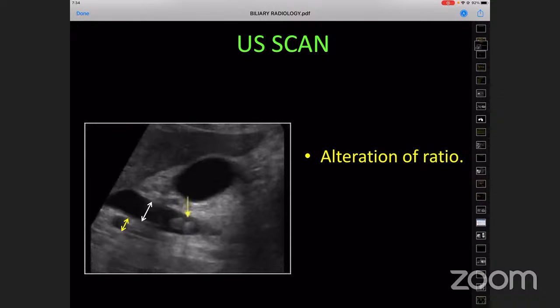When we do ultrasonography of the upper abdomen, we first see the liver. This is the dictum. We see the liver properly, carefully, and if we see the IHBRs are dilated, intrahepatic biliary radicals are dilated, even if it is a minimal central dilatation of the intrahepatic biliary radicals, we start suggesting probably there is some obstruction downstream.